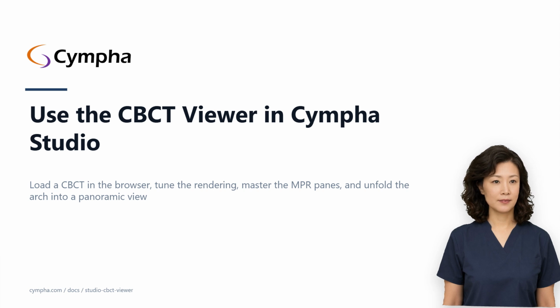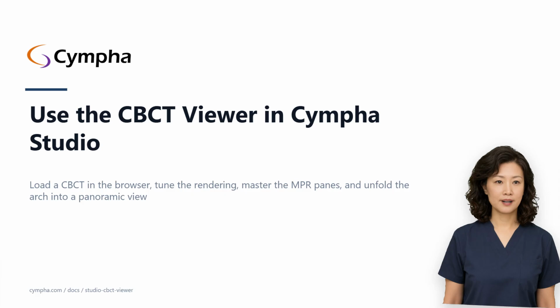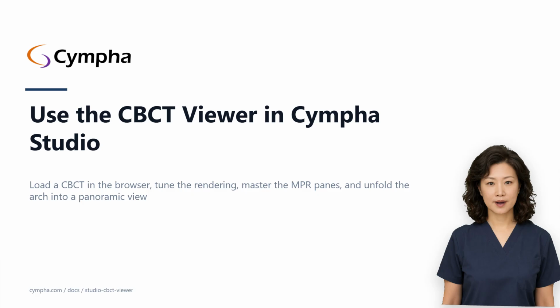On a familiar CBCT, the whole routine takes about 10 minutes. The decode itself runs maybe 20 to 60 seconds, depending on the volume and your hardware. Follow along on screen, or listen now and read the written guide later.